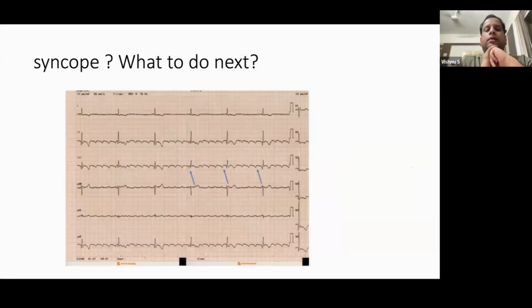What do the arrows show? You can concentrate only on the arrow, the P and QRS relation, and you can tell what the atrial arrhythmia is and what the AV conduction pattern is in this patient. Also see what atrial arrhythmia is going on, and what the P wave to QRS relation is. Is it fixed, or is there any conduction abnormality with the arrhythmia?